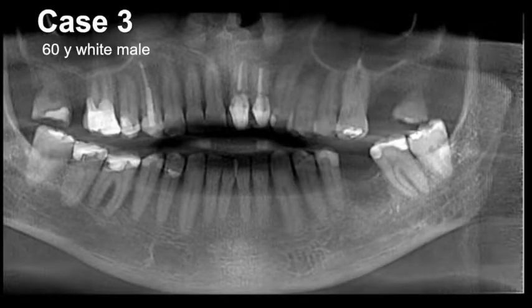We don't do that. So here, 2 cases, and then we'll call it a day. Find the defect for me. Shout something out. Where do you want to look? 19. Everybody wants to look at 19. Yeah, okay. We would look at 19.